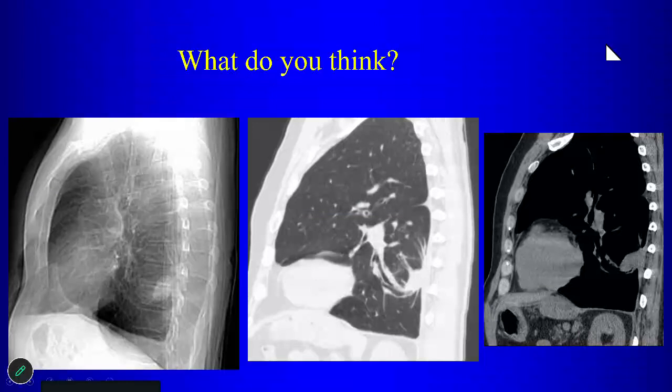What's going on in this patient? There's this opacity on the lateral view that's evaluated there with CT. This kind of looks like round atelectasis. Yeah, so what are the findings that tell you it's round atelectasis? Is it called the galaxy sign? No, it's not the galaxy sign. It's a wrong TV show. Yeah, something about space. Spaceships. Comet tail sign, right?